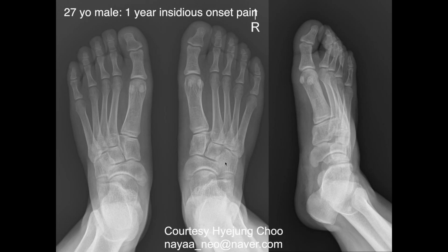Okay, Michael? John, yes. Unless there is edema around these ossicles or some kind of inflammatory changes, you have to consider that that's not the area of injury. Right, unless there's a marker right over it. I agree. I don't think that last one was. I think that was just a normal variant.